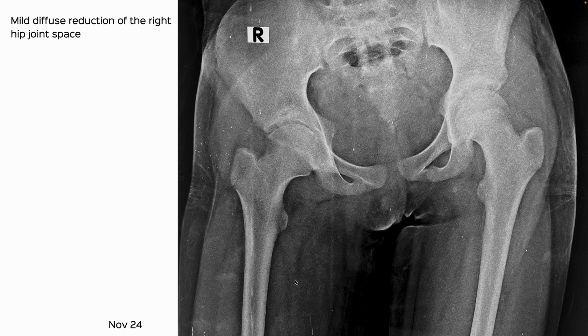There were only films, no soft copy images, so we actually had to struggle a lot to get the right quality of images for the presentation. But here are the images.